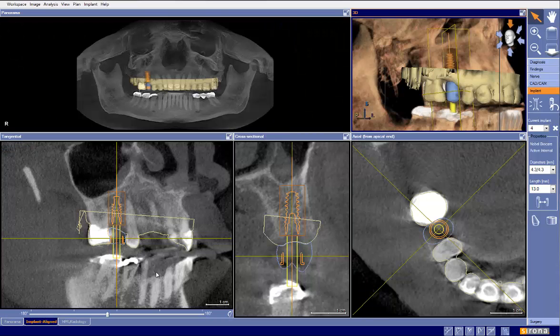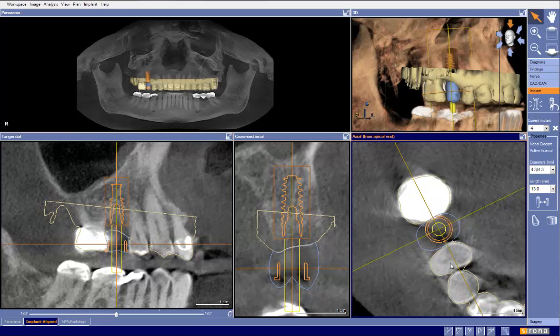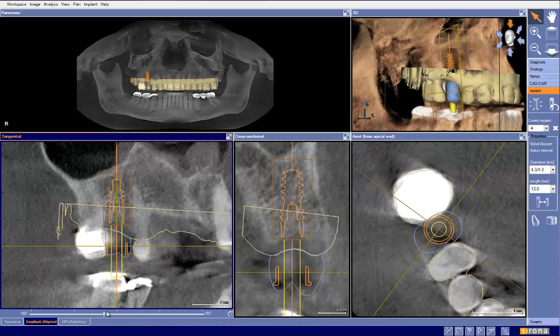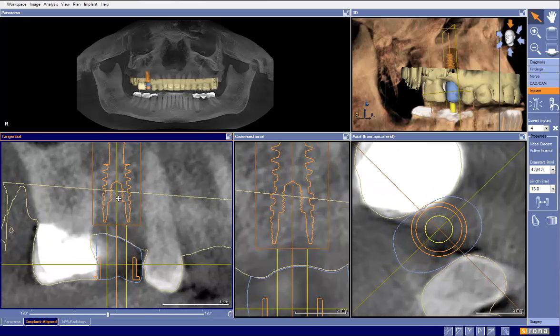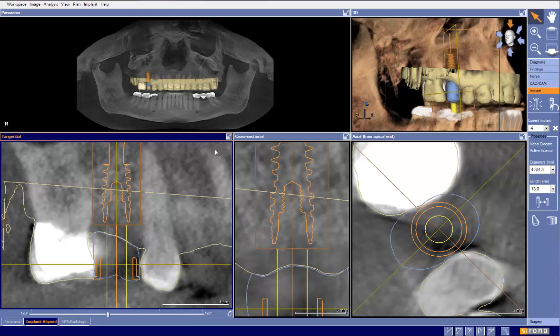And once we do that, if you also notice, the next step is going to be the other thing we can take a look at from this occlusal table, that we're definitely a little bit more distal than mesial. We're hitting this tooth, so our options are to move, but it's a pretty tight space. So what I would prefer to do in this particular case is, in actuality, we're a little tight here compared to here, so I would actually like to move this to the mesial, somewhere about right there.